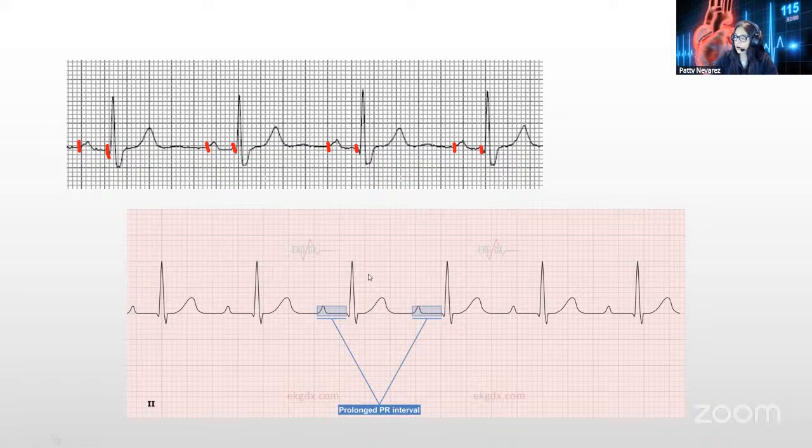I can take a look at the heart rate, and it looks more or less okay, right? So it's 300, 150, 100, and before it gets to 75. So it's about 80, I will say, somewhere like that, which falls into normal.